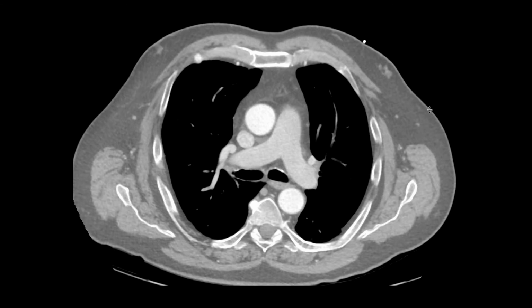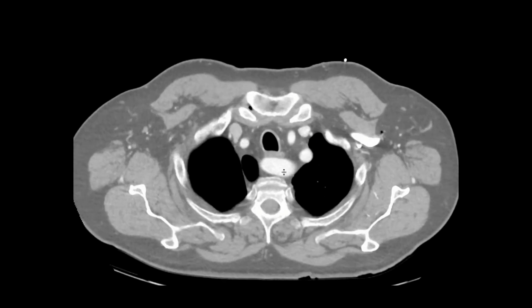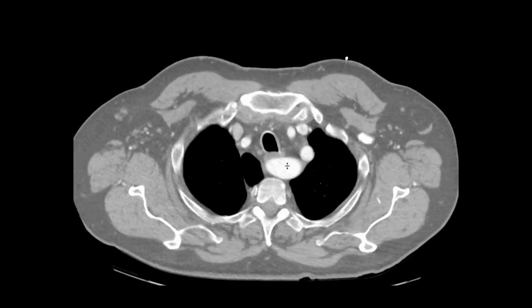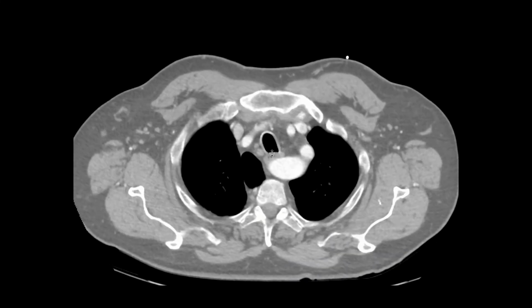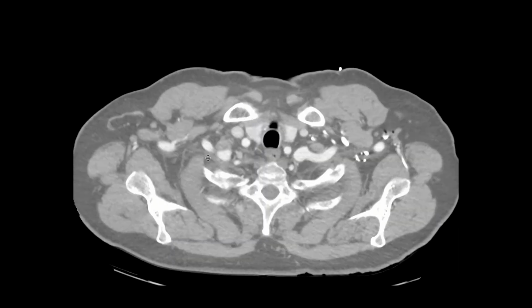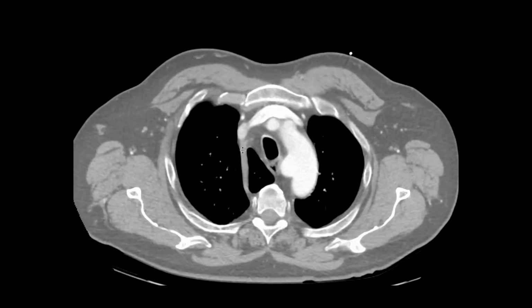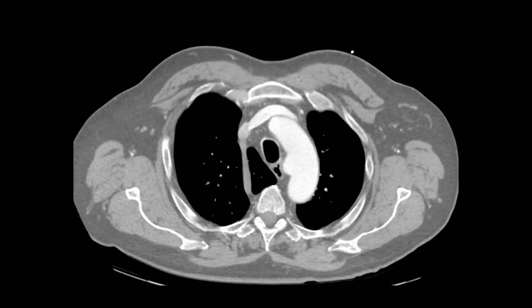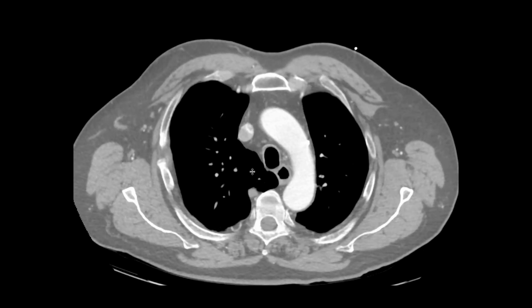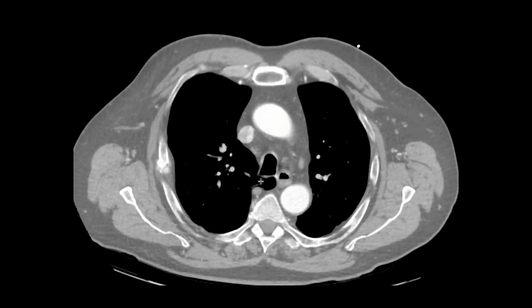And now let's get into the case. Here we go. Okay, so this is a typical chest CT, right? We have some contrast on board. We have this cool little anatomic variant here, an aberrant right subclavian artery with a retroesophageal course, so it's coming across the chest and going towards the right shoulder. Another anatomic variant: you have this azygos vein coming across the lung, as opposed to being more in the mediastinum. Here it's crossing lung tissue, so we call this a right upper azygos lobe.